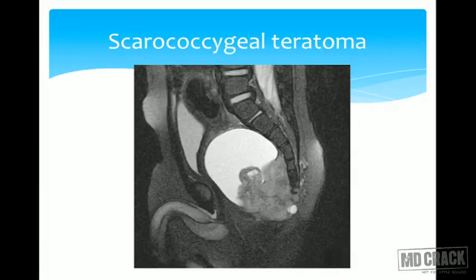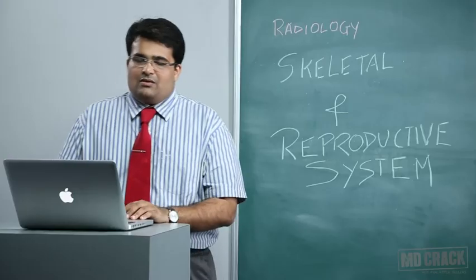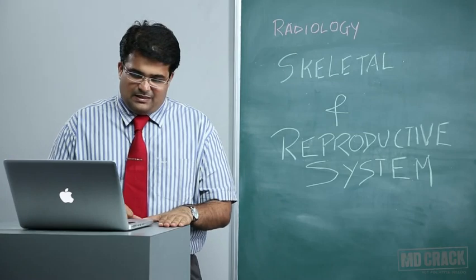So once we're done with that, we go to other congenital spinal lesions, which this one over here, MRI very well shows you a presacral mass over here, and this turned out to be a sacrococcygeal teratoma. So after that, we're done with the spine.